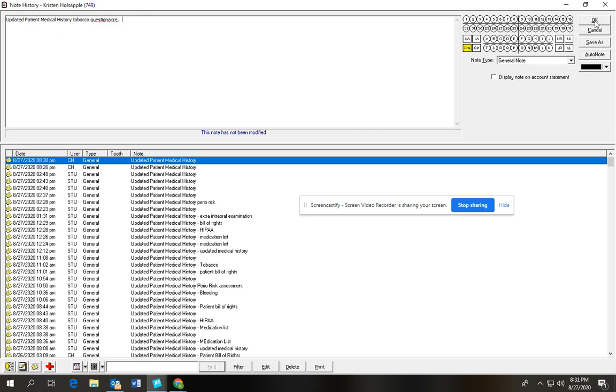I'm sorry. But I hope this gives you the gist of perio and how we do it on Patterson and Eaglesoft. If you ever have any questions, you can always ask me or Mrs. Hartrick or Mrs. Zamagoni or whoever is in clinic. We will gladly help you. And guess what? If we're not sure, we're just going to do our best. It's not a big deal.